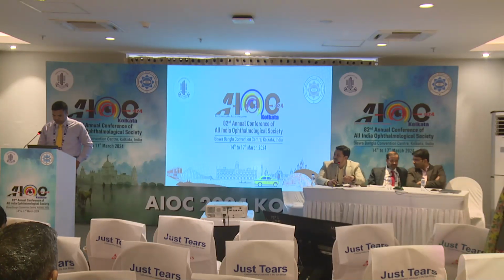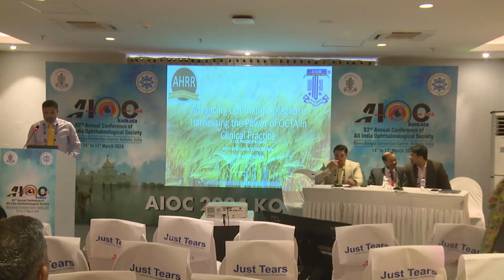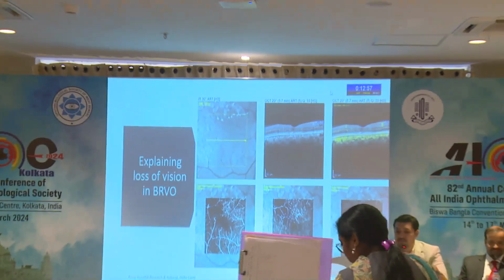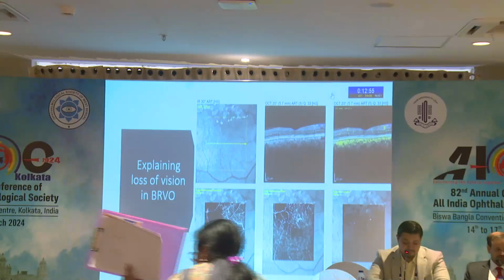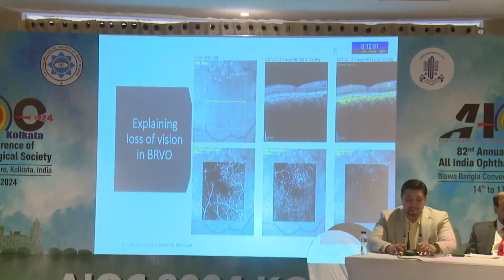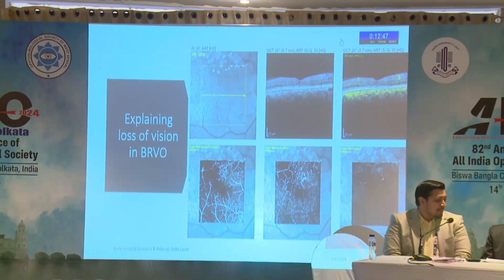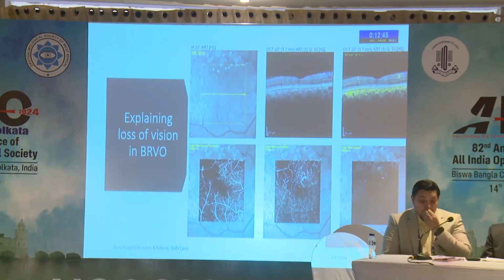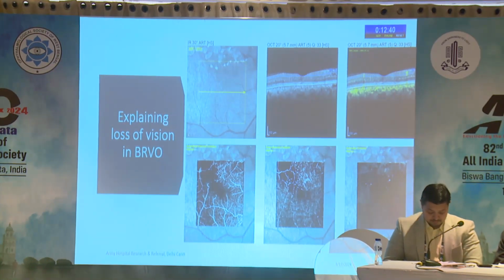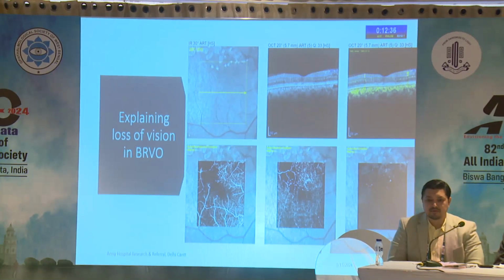Pradeep Kumar, sir. So in the interest of time, I'll be a little faster, and come straight to the point of where exactly OCT angiography helps. So this is a case where if you see the OCT on the top left hand corner, it does not tell you much about the changes that are happening at the fovea. You may feel that the patient is having 6/9, 6/12 vision. Why so? You may not be able to answer. But the moment you look at the OCT angiography, the capillary dropout areas, you are able to predict.